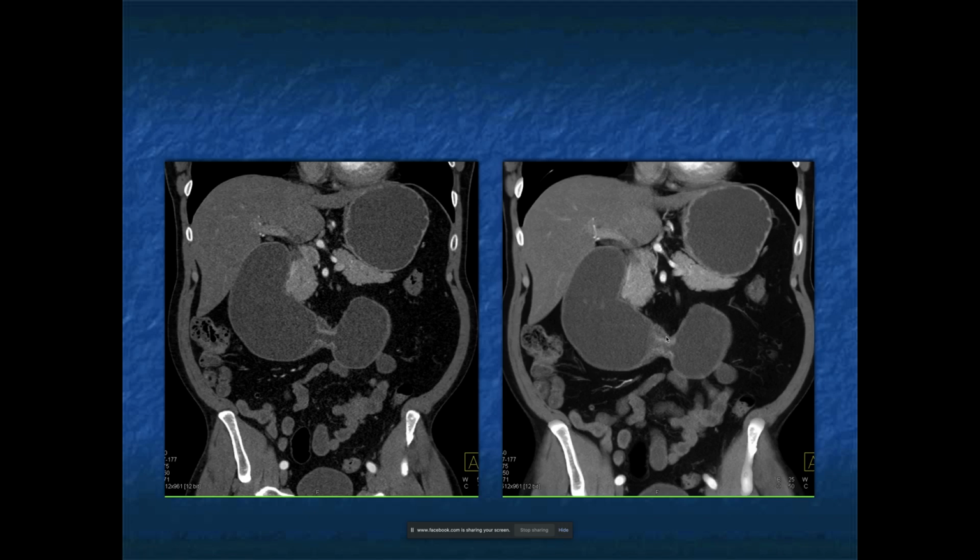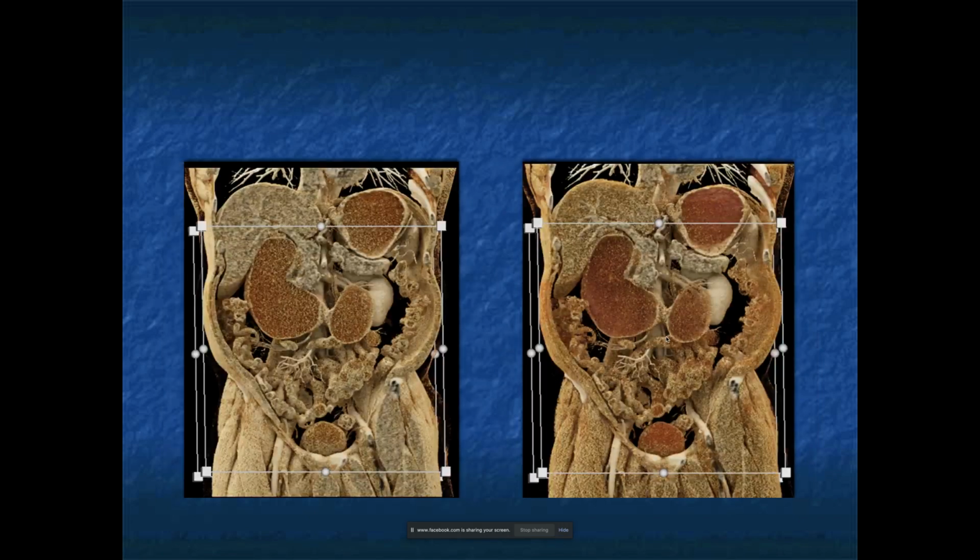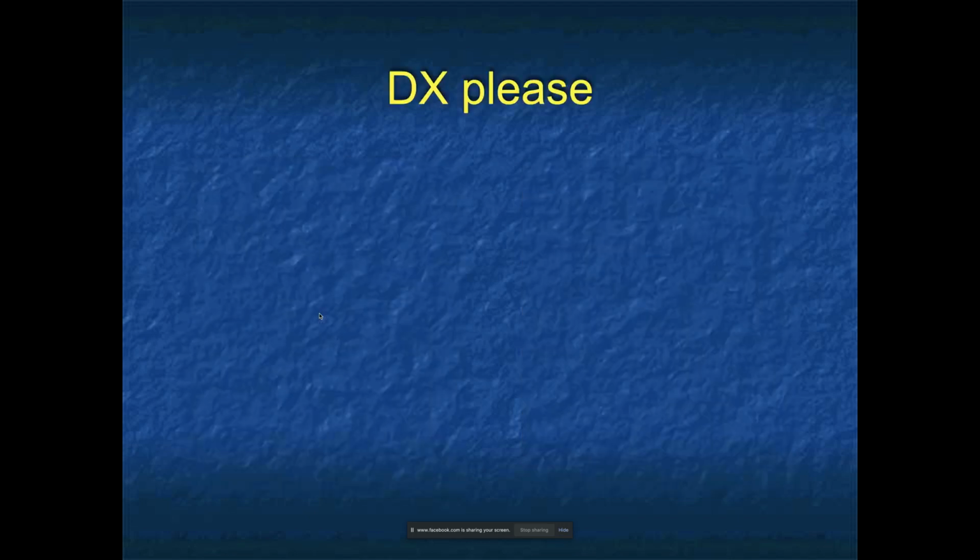What are we dealing with? So again, one lesion alone, I agree with you, I'm thinking about cancer adenocarcinoma. But two lesions, you've got to think about strictures. What can give you strictures? Inflammatory bowel disease is one, prior ulcer disease, but that would be a really funny appearance, I would have to admit as well. So what are we dealing with here?